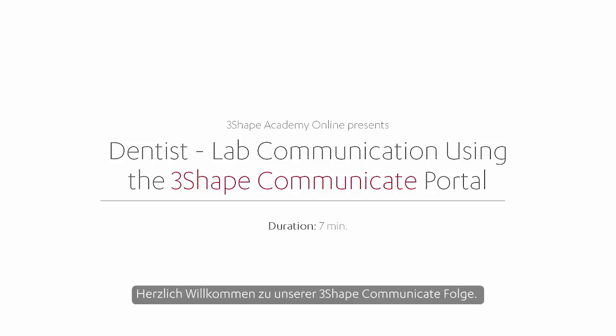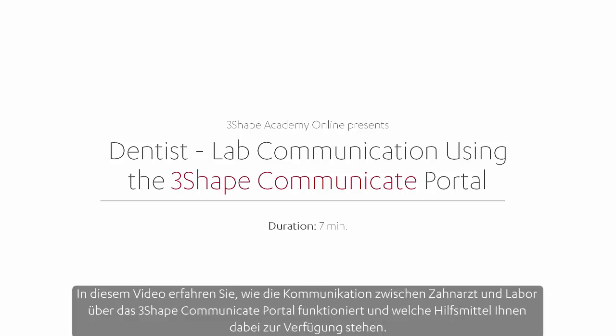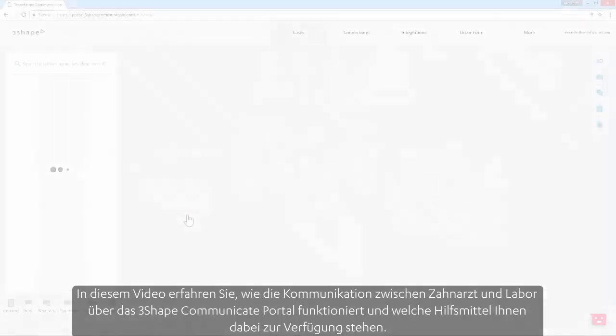Welcome to our series about 3Shape Communicate. In this video, you will learn how the communication between a dentist and a lab via the 3Shape Communicate portal works and what kind of tools can be used for that.